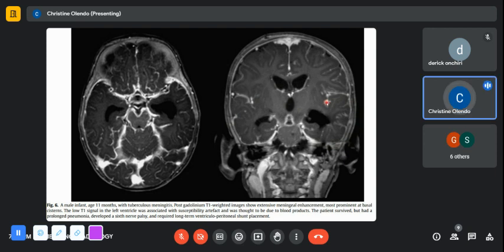You have this. You have what? You have this. No, I describe. You have what? I don't know how to describe them, but you have the focal lesions. Isn't it rounded focal lesions?